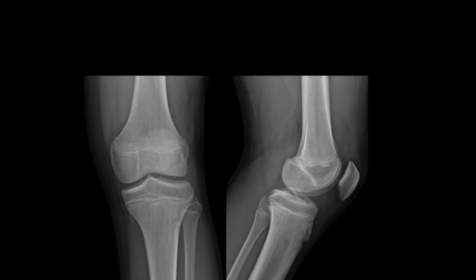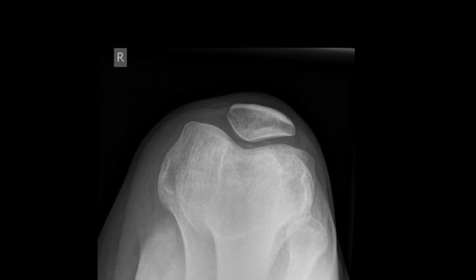Looking at this x-ray, the main thing I want to point out will be the appearance of growth plates, so we can see quite clear lines over here. This will be a teenage x-ray where the bones have not completely fused yet, and these are the physes or the growth plates. We can also see a skyline view sometimes, and the most important use of this will be to look for patellar fractures.